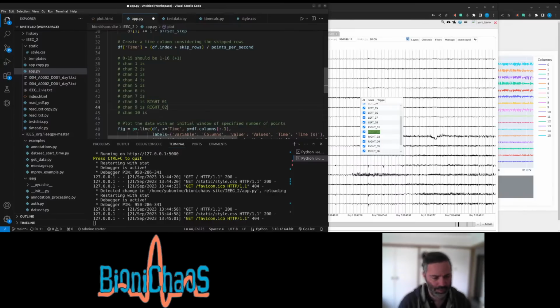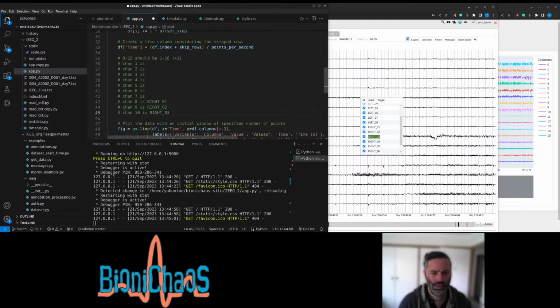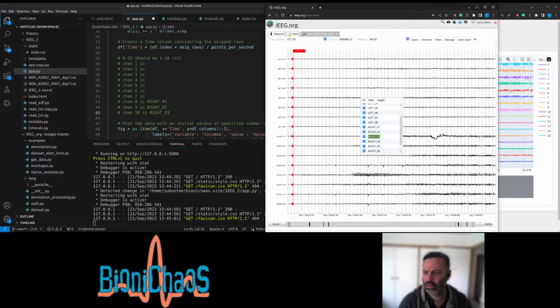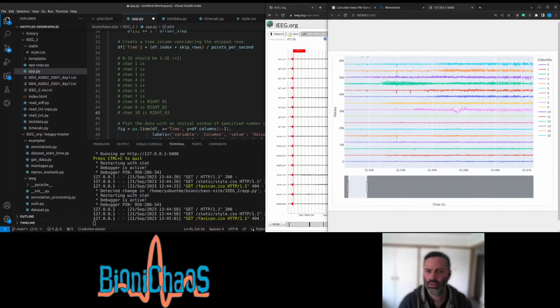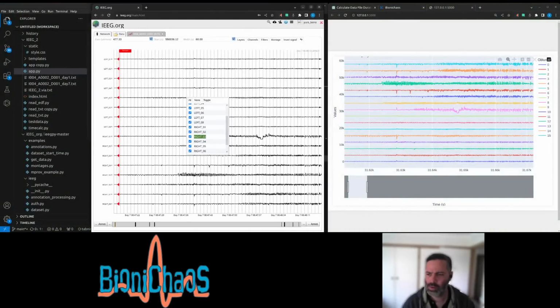Channel names. And I would check. So this one, 8 is right of 1.